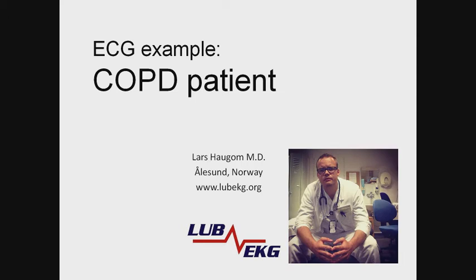Back again with another ECG case for you, this time a measurement taken of a COPD patient.